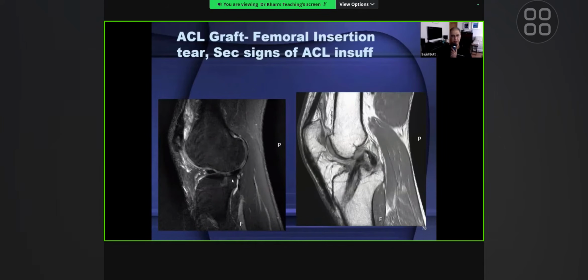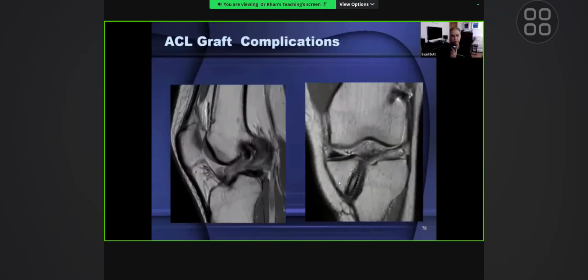So you will have the anterior tibial drawer, and you'll have the hook-shaped PCL. We will have disruption of the ligament fibers with lack of visibility of the reconstructed ligament fibers in the intercondylar notch, both on sagittal and on coronal imaging.